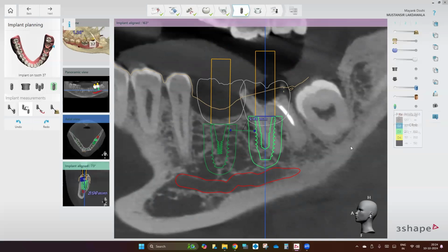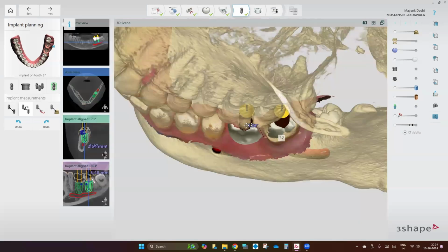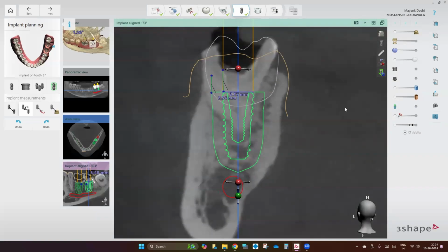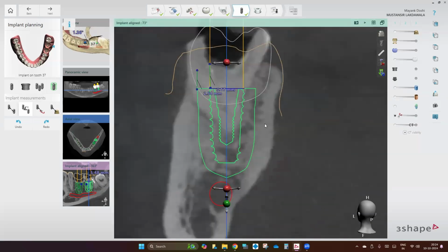तो कहाँ गया? हाँ, ये आ गया मेरा, सॉरी, ये आ गया मेरी बोन डेंसिटी, जिसको मैंने ऑन कर दी यहाँ पे. ओके, so I can actually go ahead. क्या हो गया है आज इसको? Something is fishy today.